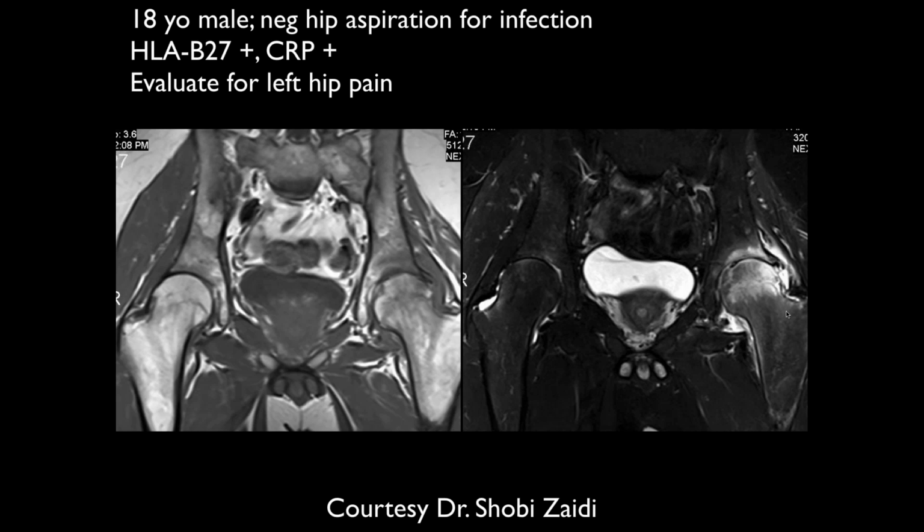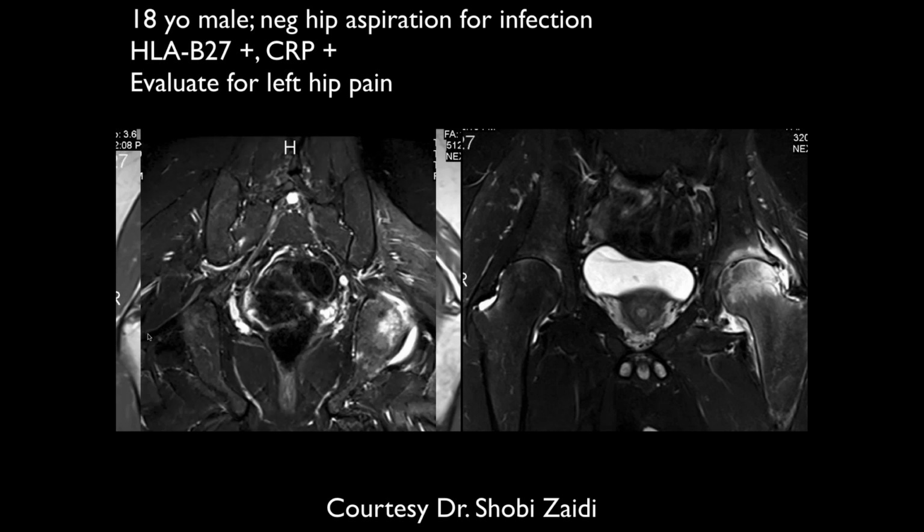And also the SI joint, I'm not sure on the right side if that's partial volume or there's some fluid there, edema and T1 hypointensity. So I guess it could be, again, a sacroiliitis with, in this case, left hip arthritis. Yeah, we're not really in the sacroiliac joints very well, but on other images, this patient did have, well, I think I have some more images to show you. Also notice that there's a little valgus deformity of the hips on both sides too.